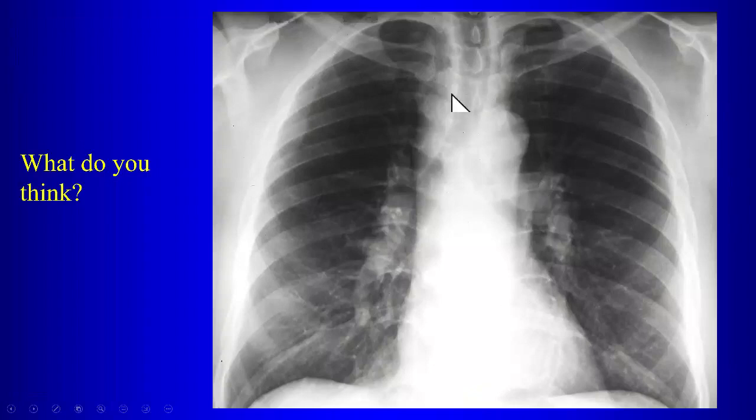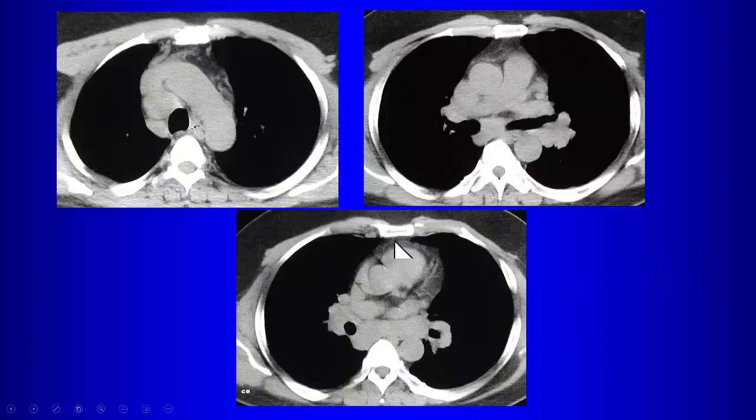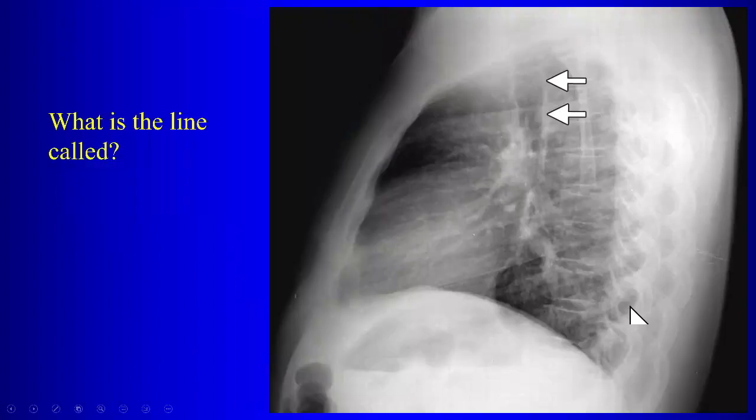Here's a patient with sarcoid who has right paratracheal nodes, some hilar fullness, some hilar nodes. On the lateral view, we notice a complete donut, so that means that there has to be subcarinal lymphadenopathy in this patient. So complete donut sign, think subcarinal mass or lymphadenopathy, if we see that on the lateral chest radiograph. So in our patient with sarcoid, we have the right paratracheal nodes, subcarinal nodes here, also some hilar nodes, more subcarinal nodes. So the subcarinal nodes give you the donut sign on the lateral chest radiograph.